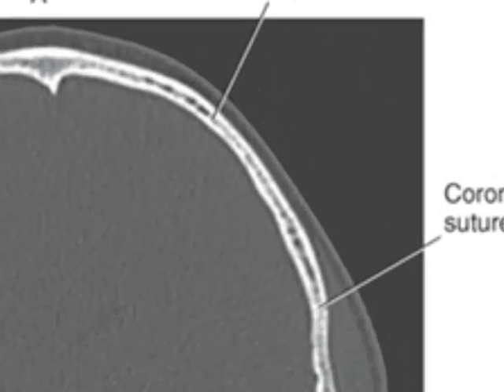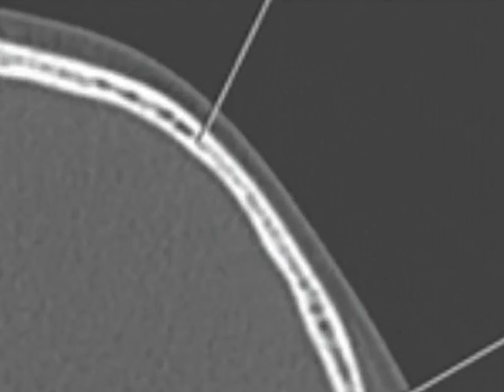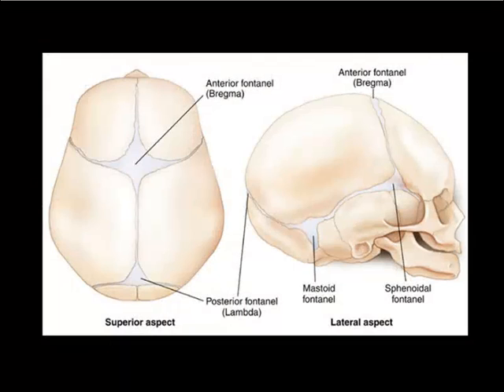You can also see the diploë, which is that material located between the hard shell-like portions of bone within the skull, visible as kind of a spongy black line. The infant skull, as we all know, has soft spots. These are actually sutures that have not yet fused into fibrous and immovable joints.